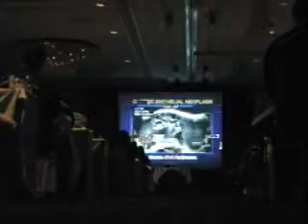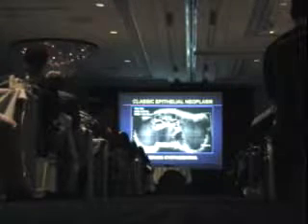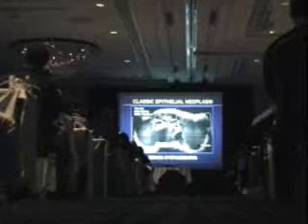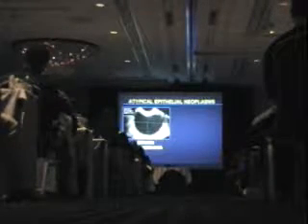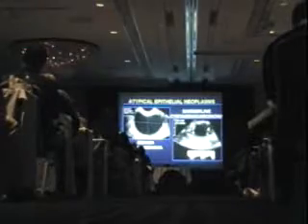The typical appearance that we see for ovarian cancers or true neoplasms from the surface epithelium, benign, borderline, malignant, we can see here, and that looks just like the picture that we saw, very complex. This turned out, interestingly, to be benign, so you really can't tell benign or malignant. Obviously, you're not going to let that sit in the patient. Benign cystadenoma. Now look at the next case. Benign cystadenoma, showing you the variation that we can have here. But notice that's 11 centimeters. You're never going to sit on an 11 centimeter mass, even if it's simple, because it's too big. 5 centimeters is sort of the cutoff.